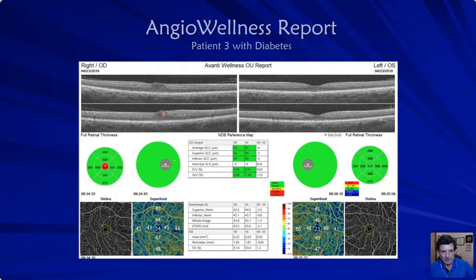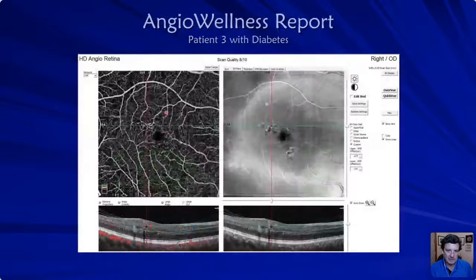Okay, this is a different patient. It's not from the vitreomacular traction or adhesion. This is actually capillary changes that are happening and getting some leaking. Again, these two complement each other. For you to have OCTs out there, probably in these years to come, you'll probably want to start looking at this technology to really complement your patients and their skills.